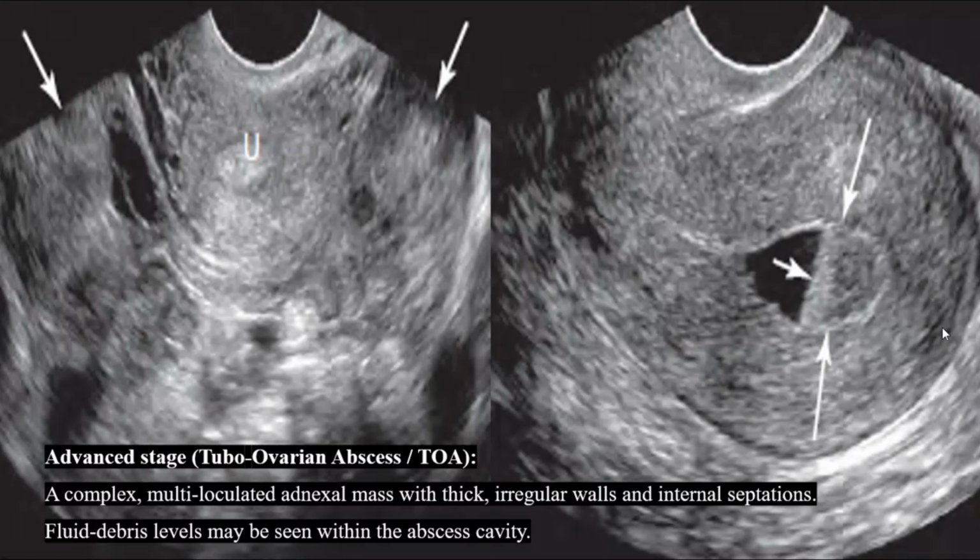And here you can see a longitudinal transvaginal image of the retroverted uterus. Here you can see the myometrium of the uterus, this one is the endometrium, and here you can see the endometrial cavity is distended, which is showing internal fluid levels due to the layering of purulent material.